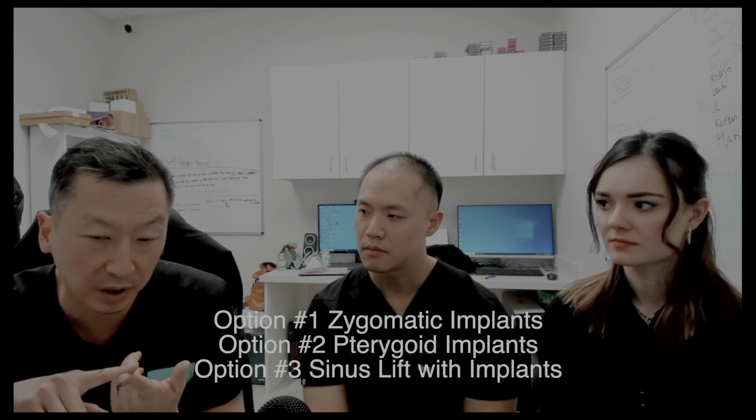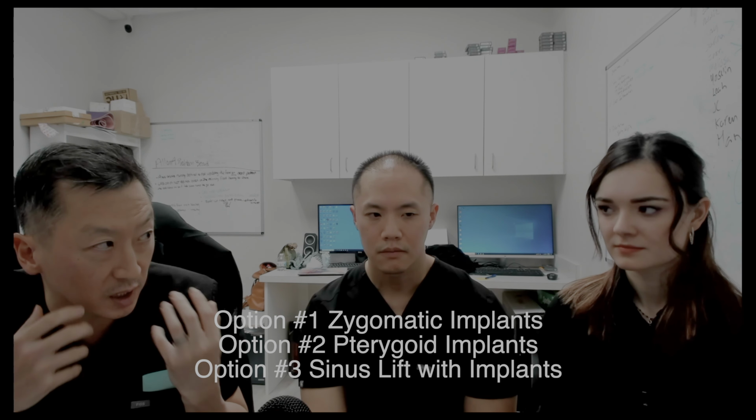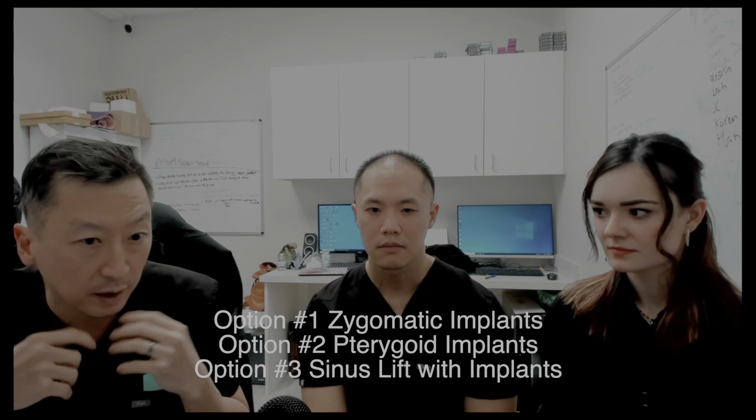Right. So whenever we see a case like that, when we treatment plan, somebody comes in like that, we see them for a consultation, we look at the sinuses, we're like, okay, you've got huge sinuses. We've got several options, right? So you can either do zygomatic implants, we could do pterygoid implants, we could do a sinus lift, but you're going to need one of those options back there to be able to give you teeth back there.